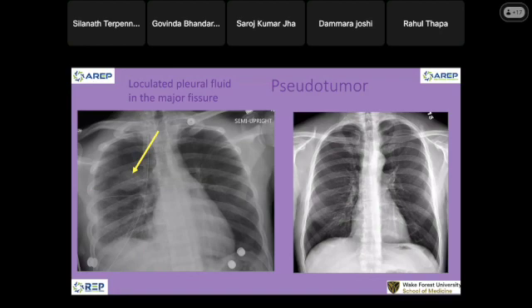If you see this mass in the soft tissue, is it really a mass? Just give the clinician a call and ask. I do that all the time. Okay, is there anything here? Pneumonia or no. This is lung cancer just hiding out in the differential diagnosis of pneumonia, because they can coexist.